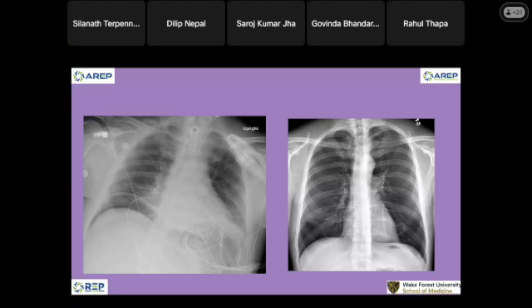Before calling the clinician, big mass, but because there is a list of things that are emergencies that residents have to call the clinician about, and this is one of them. And this is before we call the clinician. This is a big right upper lobe mass. We may not have to call this. Is the superior vena cava pushed?